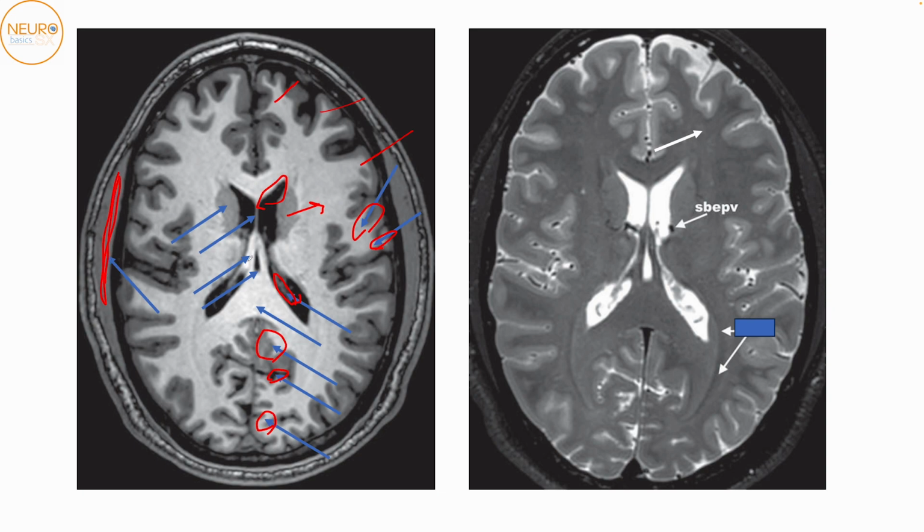Okay, so apart from that, we also have some slightly complicated structures over here. So this would still be the splenium, or basically the corpus callosum and the splenium over here. Here you have two structures which are wrapping around this T1 hypointense structure. This T1 hypointense structure is actually the superior border of the third ventricle. And these two structures wrapping around it are the fornix. This here is the septum pellucidum. This is the fornix. Okay. And this is the third ventricle roof.